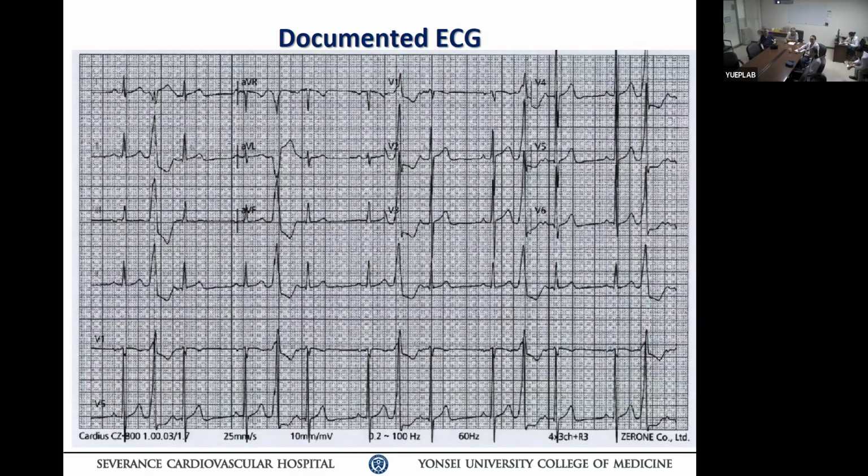What does that mean to you? Perhaps the left atrium is dominant in this patient, which is indicated by lead 3. Look at lead 3. The P wave is biphasic, correct? The negative portion is bigger than the positive portion. Biphasic, right? That means the left atrium is dominant, driving this patient's atrial activity. So start reading those things carefully.